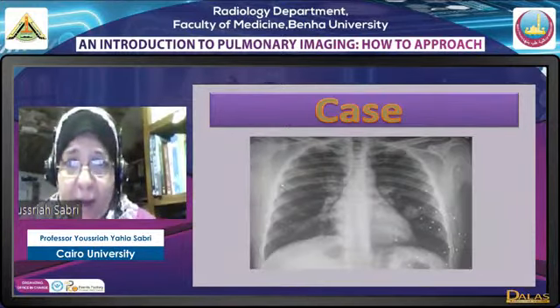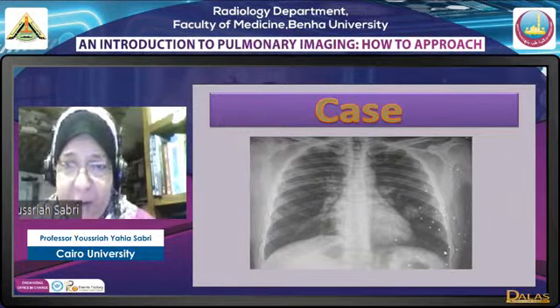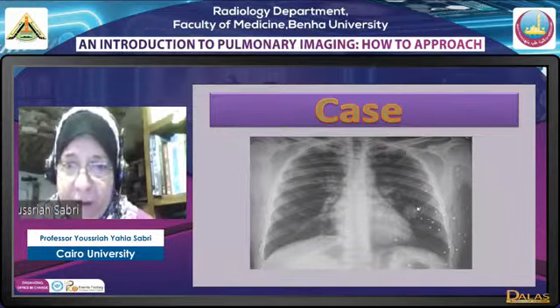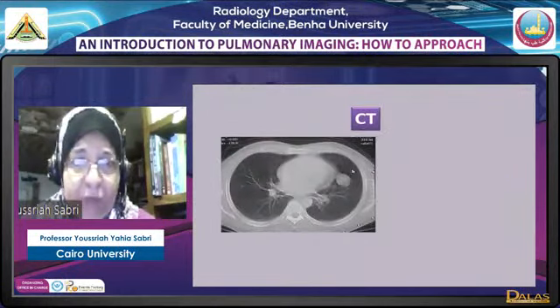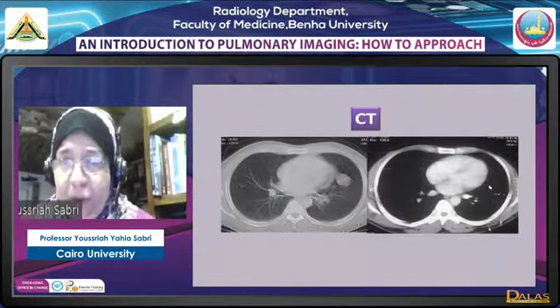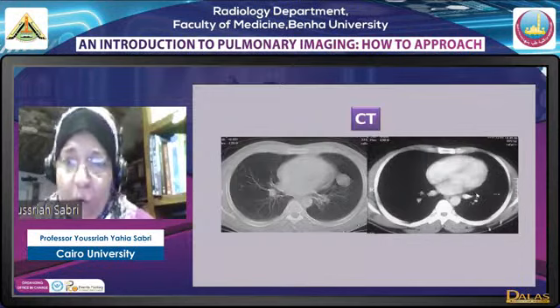This case is a young male patient. He was at a wedding and he got some gunshots, as you can see. He went to do an X-ray and an incidentalloma was present, a lesion that is incidentally discovered. He did a CT and the mass was seen in the lingula in the lung window, while in the mediastinal window no lesion whatsoever was seen. So where did the lesion go? Simply, it's a fat density similar to this. With fat density, we are dealing with a lipoma of the lung, which is an extremely rare lesion.